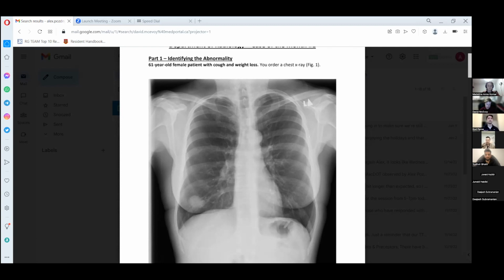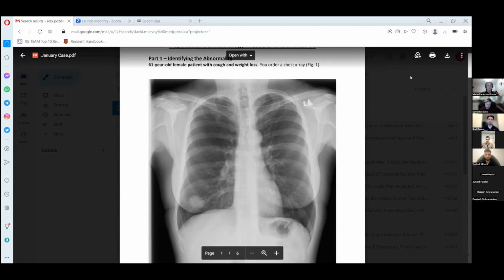So without further ado, we can look closer at the anatomy of this chest radiograph and talk a little bit about the approach. Generally speaking, as you start early on with chest radiographs, you want to be very systematic and make sure you look at everything. Everyone has their own method of looking at things. There is no universal right way to examine a chest radiograph, but the only right way is to make sure that you include everything in your examination. So the order doesn't really matter.